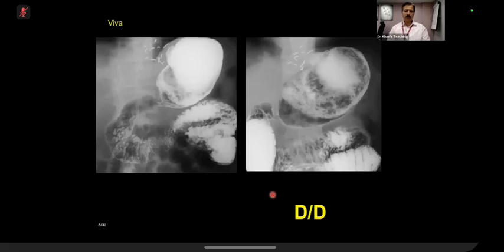This is your last film, but it is a very, very good film. Over to you. Because of time factor, let me tell you that if you look carefully, the posture of this is slightly different than this. There is something here, and that something has moved now. Over to you. And there is a bit of surgery also.